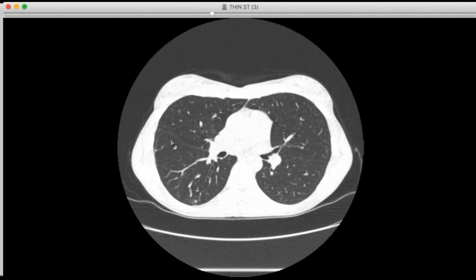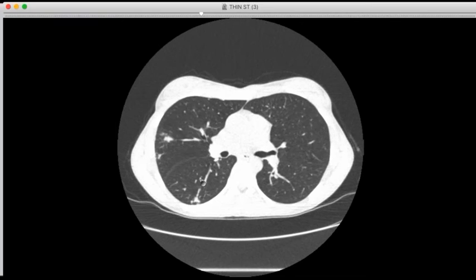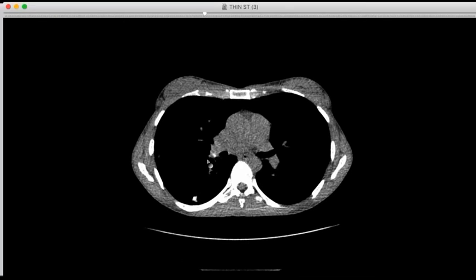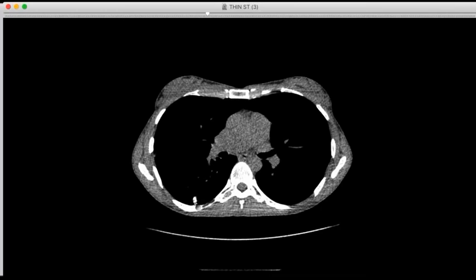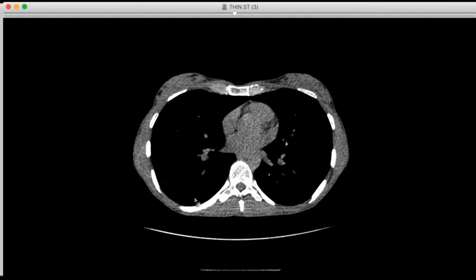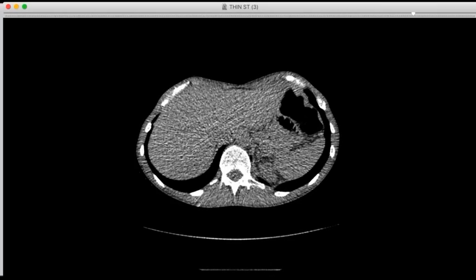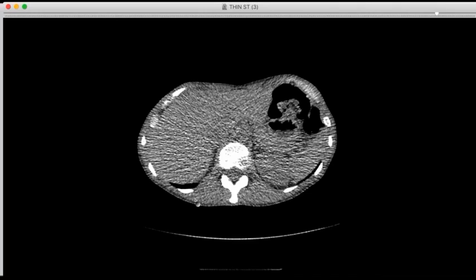So it may be scar from an infarct or just something else. But this is a very classic evolution of histoplasmosis, where you get this dominant nodule, the satellites, and then over time, and it can take years, it starts to calcify. And I know David's going to ask me about the spleen, which she did not have any calcifications in her spleen.